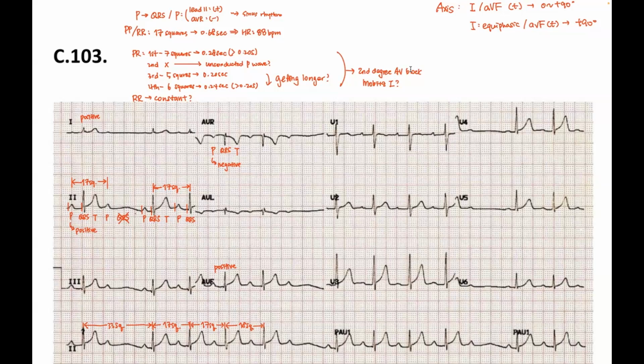But I think the rhythm is irregular, because after the first cycle there's a P wave without a following QRS. You should point it out if you could, but I can make some notes if you let me. For example, this P is not followed by QRS. So I think it is second degree AV block.